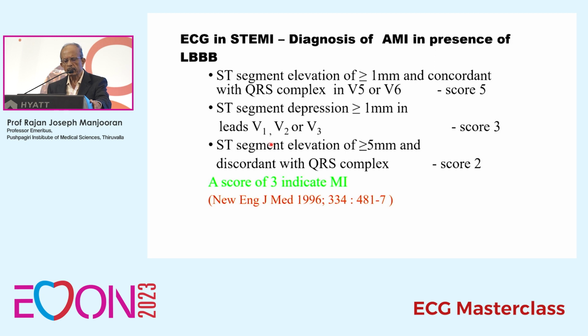Now the complications of acute myocardial infarction can be easily picked up by electrocardiogram. Here is an example of a patient with previous myocardial infarction. He has got a trifascicular block. What is meant by trifascicular block? Any one of you?